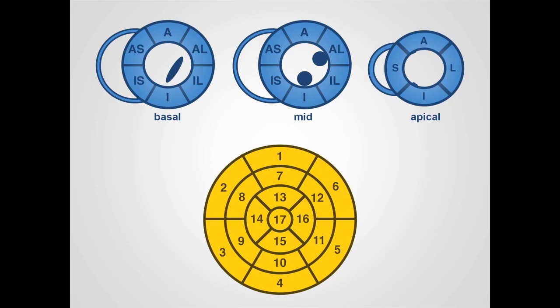When we report areas of myocardial infarction using CMR, we should refer to the standard myocardial segments to do so. Most centres use a 16 or 17 segment model. In this, the basal slice of the left ventricle, this is a short axis view of the left ventricle with the right ventricle seen just here, and the orifice of the mitral valve here.